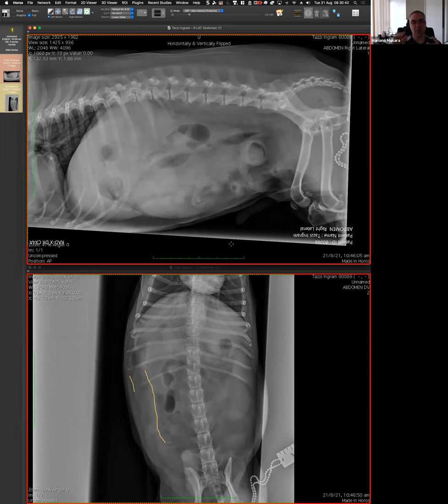We don't like the opacity. We don't like the diameter. We think it's small bowel. The puzzle here is, why is it that we are not seeing the cause? Someone could argue that just the dilation of that bowel loop is already a feature of obstruction. But there is this extra question, which is, why don't I see the rest of the small bowel very distended? And now you are saying, well, maybe these two are connected. So move that forward. Go on. How are you going to put things together? How is that helping you?